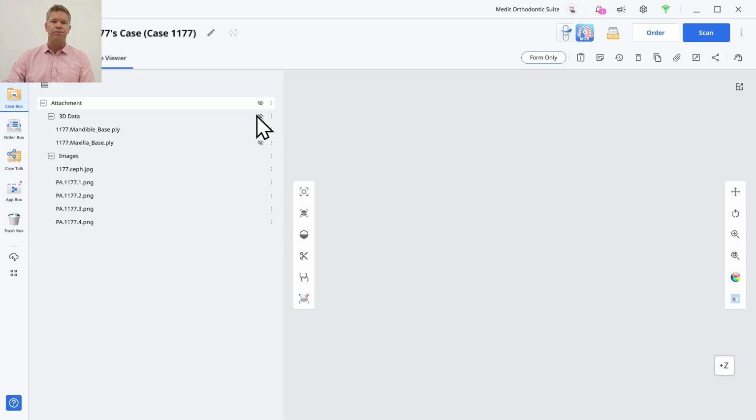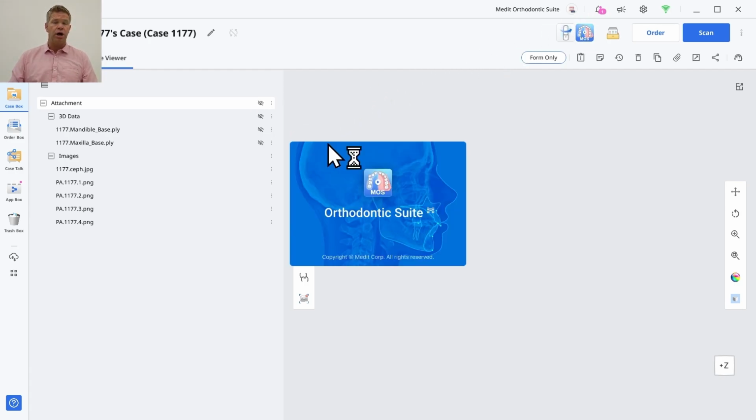Once I've got all the patient files uploaded and ready, for this case, 1177, I'm going to hit the MOS button, which will launch Medit Orthodontic Suite.